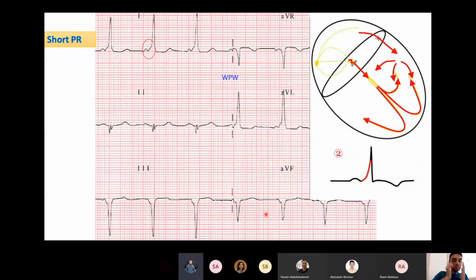Yes. Okay, so often with WPW you get wide QRS and abnormal axis. For example, here these are all negative deflection QRS, and when you see this, often you worry about a scar. You worry that this patient had an inferior infarction, for example, because you have Q waves in the inferior leads.